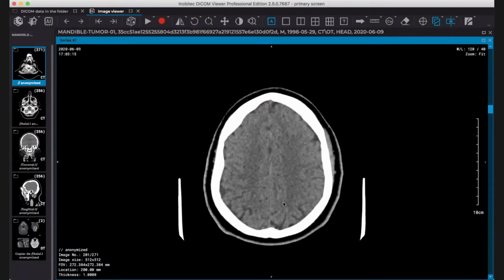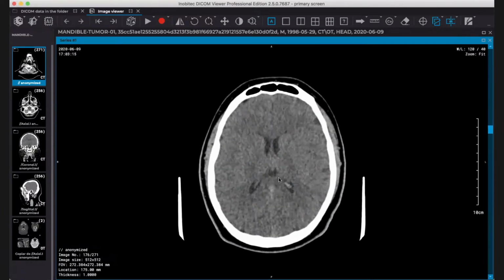And as I was telling you, I am going to quickly review some of the tools which I think are very important, because even if you're going to segment and create a 3D structure, there are some nice things that we need to know with the 2D image viewer.